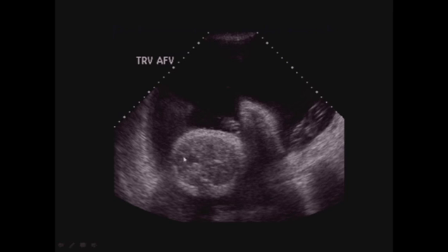However, why do we have a stomach bubble? There's a stomach bubble because there was a large fistula from the right mainstem bronchus to the distal esophagus, and all of the fluid that by traditional diagnoses should have distended the lungs and let us make the diagnosis of tracheal atresia, all of that fluid was dumped down into the stomach, and we had no ability to identify this complete tracheal esophageal atresia.